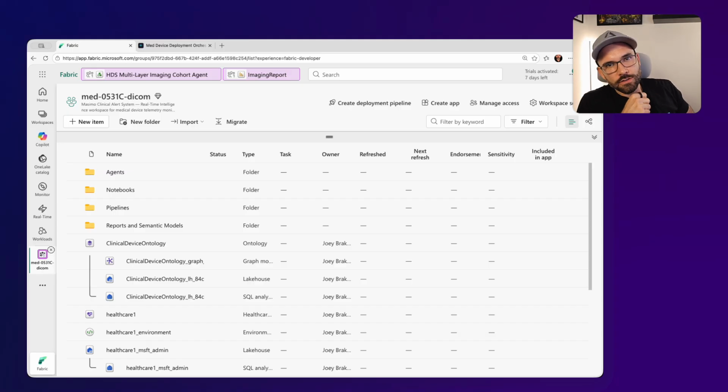The data agent is a really interesting thing inside of Fabric, and we couple it with the use case of trying to explore and find new patient demographics or cohorts that have medical images. In the past it's been hard to find out which patients have images and which patients have information in the EHR, and they're not necessarily linked to each other.